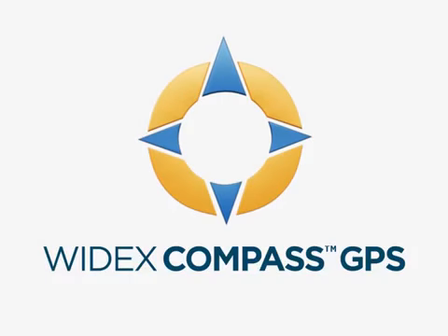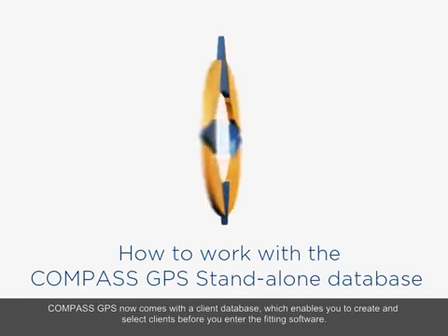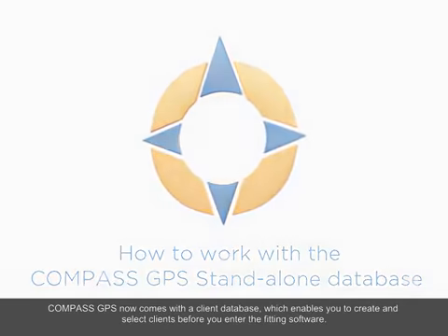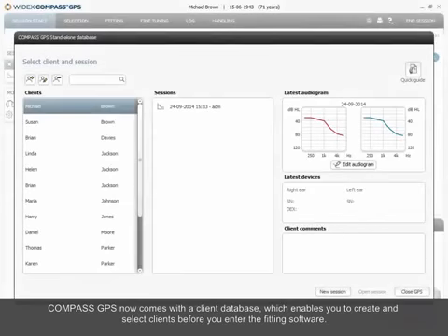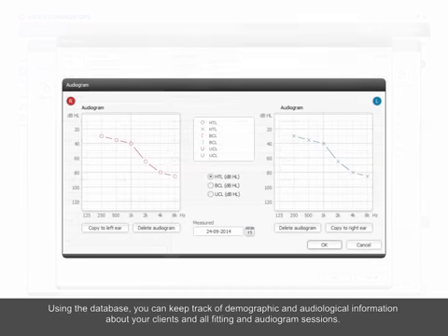Welcome to this e-learning tutorial on working with the Compass GPS standalone database. Compass GPS now comes with a client database, which enables you to create and select clients before you enter the fitting software. Using the database, you can keep track of demographic and audiological information about your clients and all fitting and audiogram sessions.